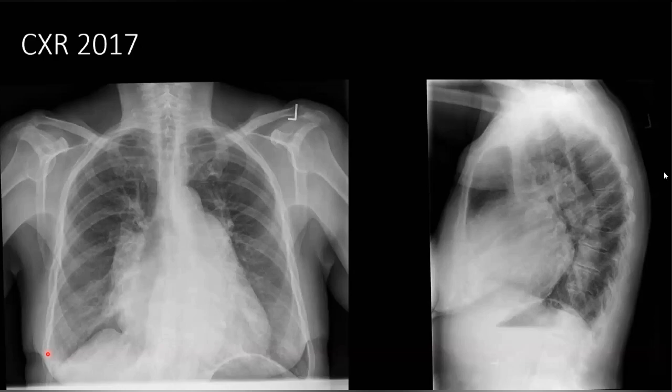A young female. I'll present. Chest X-ray, frontal and lateral projections of a skeletally mature female patient. In this X-ray, I appreciate there is bilateral hilar lymphadenopathy. Bilateral hilar lymph nodes are enlarged, and moreover, I can see the cardiac shadow also appears to be enlarged, but I would like to take the CTR as in my normal clinical practice.